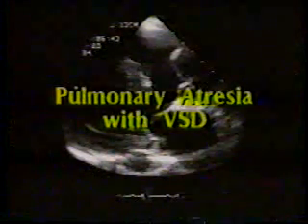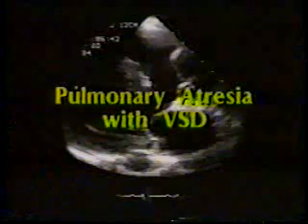For delineation of site and severity of the associated right ventricular outflow tract obstruction, we utilize short axis views and continuous wave Doppler interrogation as has been illustrated under the discussion of pulmonary stenosis. Several adult patients with tetralogy of Fallot present with probable acquired pulmonary atresia.